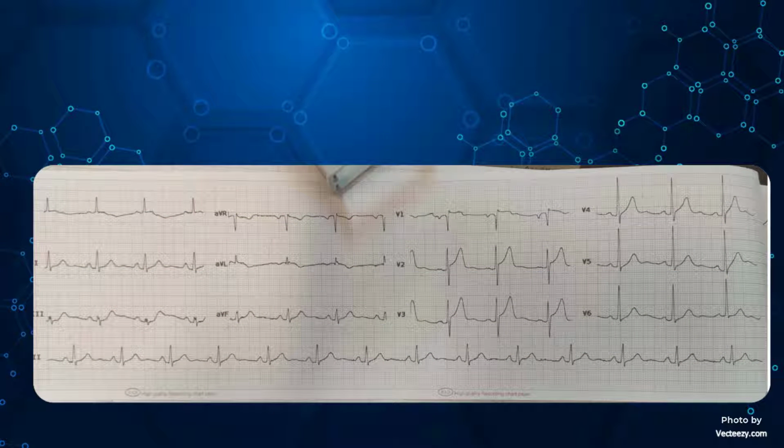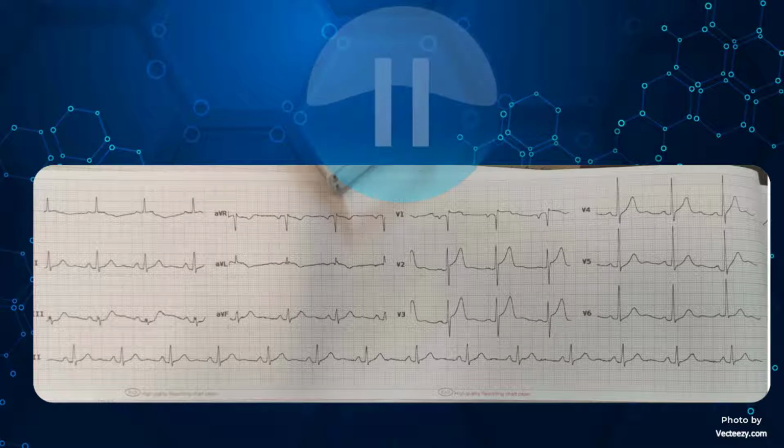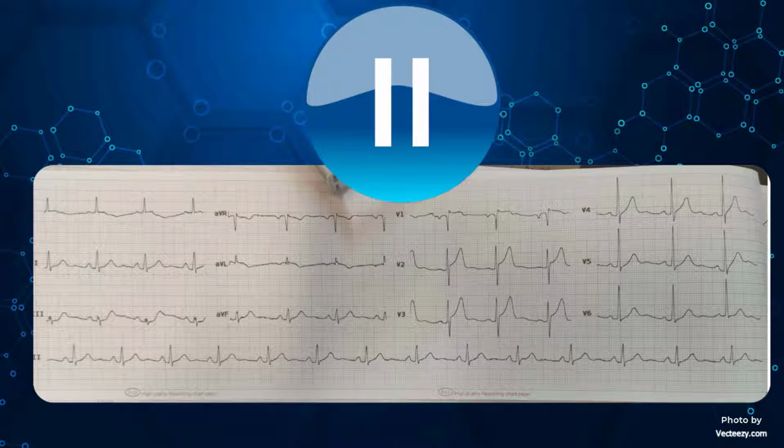Now, let's test our knowledge with several examples. Here's an example for you. Try to mark the PR interval in this strip. Is it normal, short, or prolonged? Pause the video now, and measure PR interval on your own. Then play the video again, and compare your answer with correct answer.